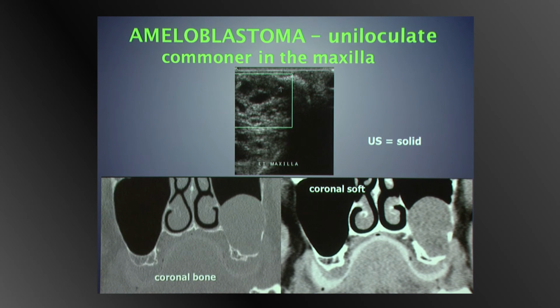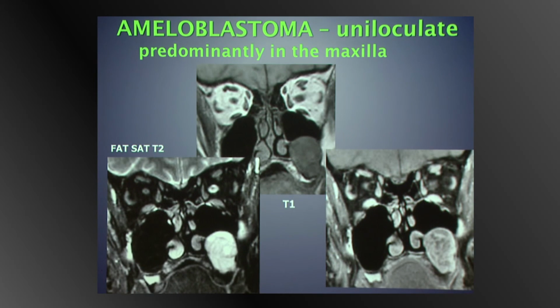And then you can diagnose tumours around the maxilla and paranasal sinuses in the most strange ways. We were asked to do an ultrasound of this case. So we did that was the first examination where you could see it was actually arising in the alveolar process. And it was obviously a solid tumour with cystic spaces. And then on the CT, you can see the elevated sinus floor. It's not fluid attenuation. It could be a KCOT, it could be a residual cyst, it could be a cementoblastoma.